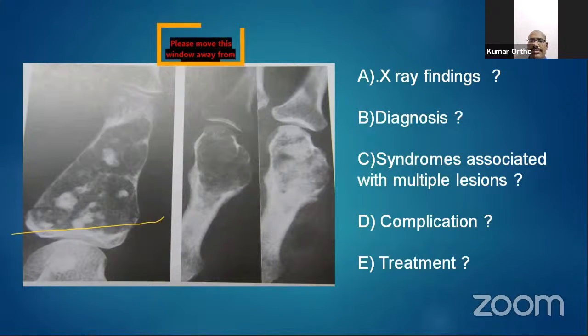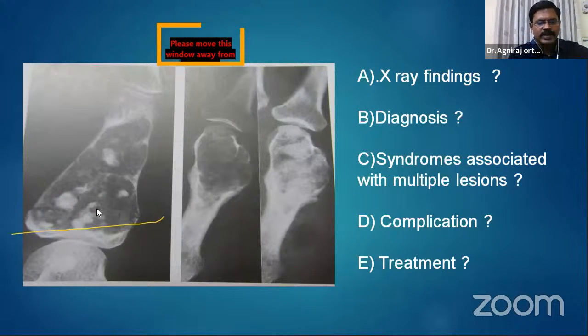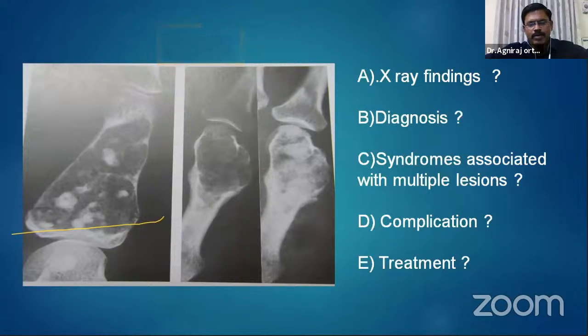First, age. Repeat, Vishal. Start from age. Plain X-ray of a skeletally mature individual showing the phalanges and a lytic lesion in the epiphysis and metaphysis. Centrally placed lytic lesion with well-defined borders and no periosteal reaction. The stippled calcification in the bone matrix. Why do you say without any calcification? Stippled means it is a calcified area only; you cannot say without any calcification. You also forgot to say it is a geographic type of lesion. Okay. Without any complications, most probably a benign bone tumor.